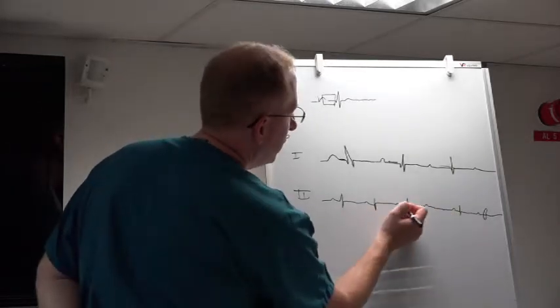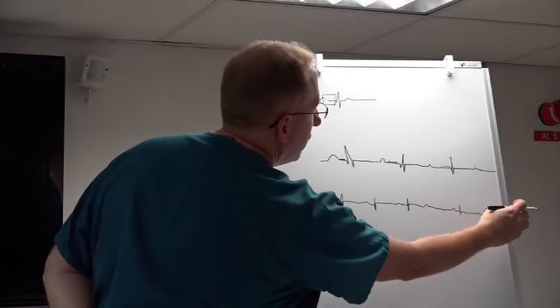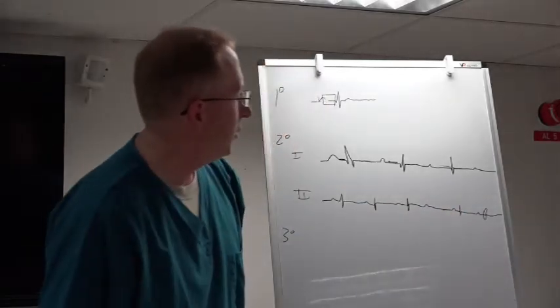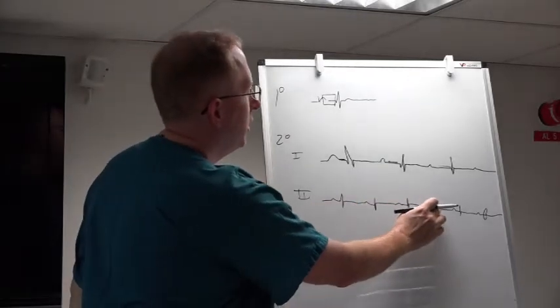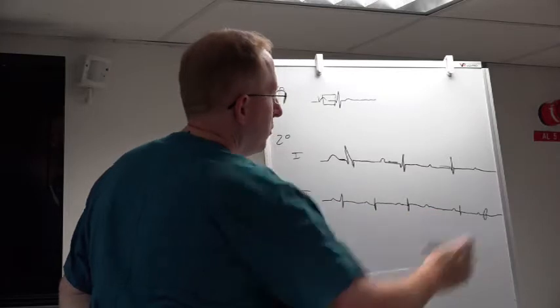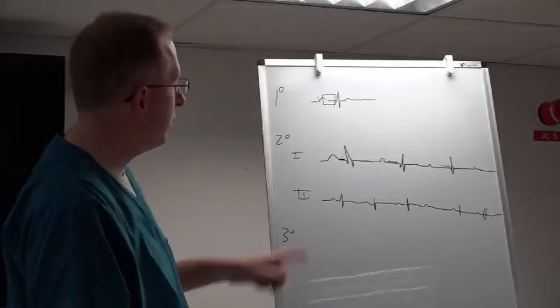But then after a few beats, it'll just drop. And then it'll pick up to look normal again, and then it'll just drop. So sometimes you might see 2, and then it'll drop. And then you see another 2, and it'll drop. So when you're looking at your strips on the test or in the book, that's the pattern you want to look for.